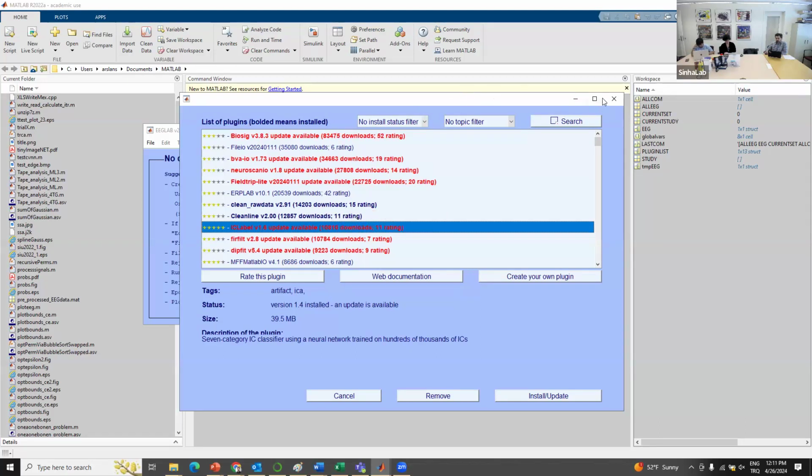But please interrupt me if you have any questions. And today I'm hoping to get our hands dirty with the EEG Lab software. So we will be processing a real EEG signal today together. I don't want it to be purely theoretical or just PowerPoint slides.